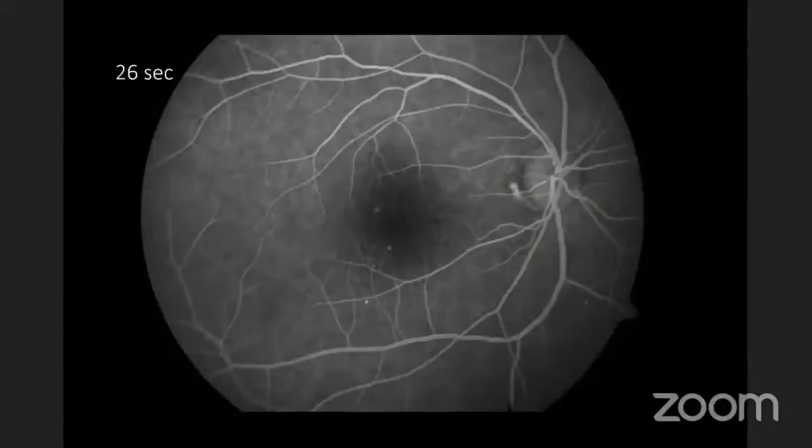The fluorescein angiography in these patients, I think at baseline is very important because it tells you the location and presence of the microaneurysms and whether they're leaking or not. As you can see in this patient, there are certain microaneurysms which are very near the foveal center and some of them are slightly away.